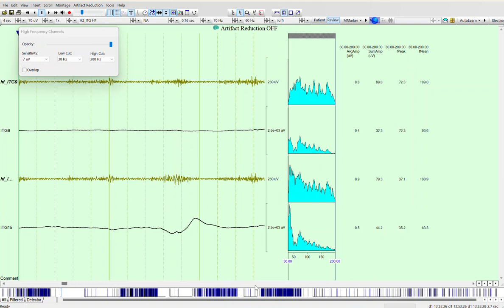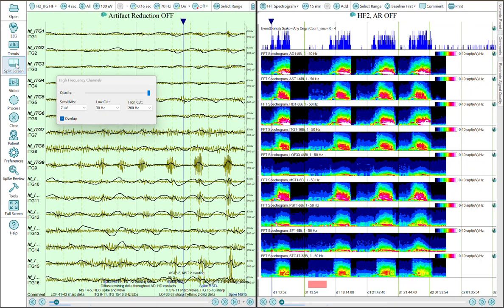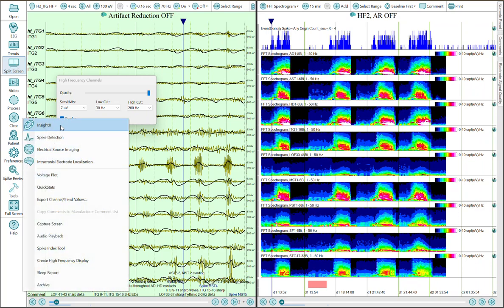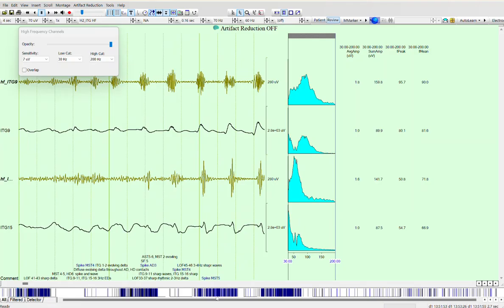There's the rather quick overview of going from a high-level view of the EEG over that time period, and doing that again in Persyst with trends, so I can navigate at a higher scale, and then going to tools and Insight 2. That's where we can go in and do further analysis.